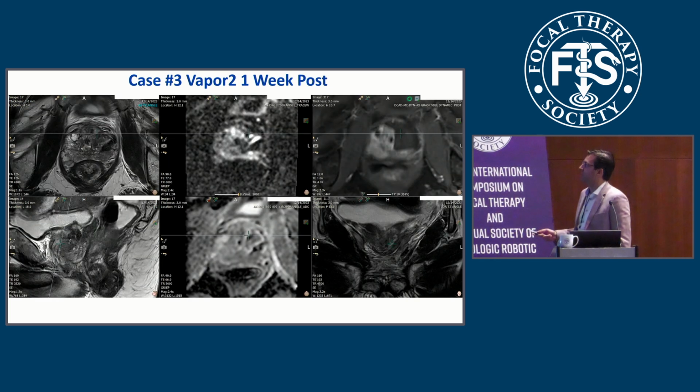Post-ablation, this is a 1 week post-ablation after the catheter is removed. You can clearly see there's absolutely no enhancement in the region. But with the vapor technology, you're taking out a larger portion of the gland, the way the treatment's designed, because you're treating the lesion, medial lesion, above the lesion, inferior lesion, to make sure the whole area is covered without really a lot of added morbidity. We've had patients in the trial and they're doing extremely well.